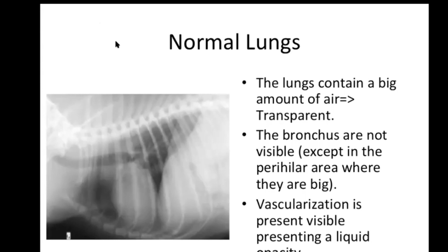Okay. First, says the lung, and then says heart. Yes. That is what is in the picture. Yes. Okay, but we will go more into details, because you will be surprised at something.